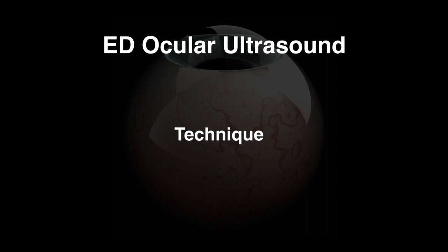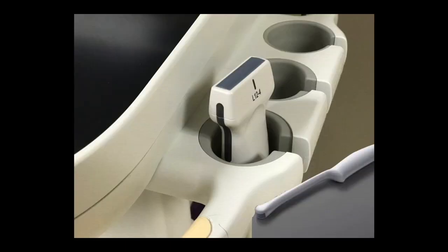So let's go over the technique. You'll want to use a linear probe. The linear probe would be ideal for anything superficial. So it's a high frequency probe. You'll be using this in the ocular setting, as I mentioned earlier, and follow the ALARA principle.